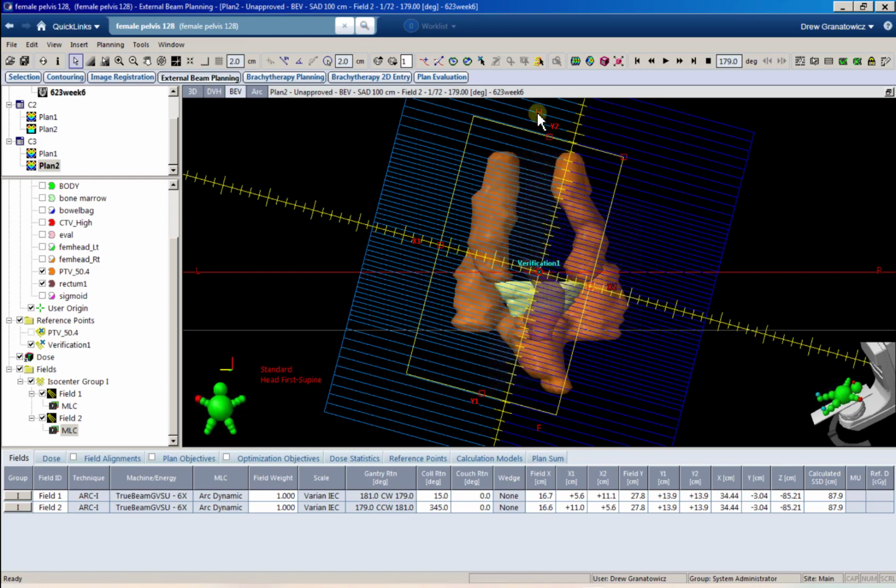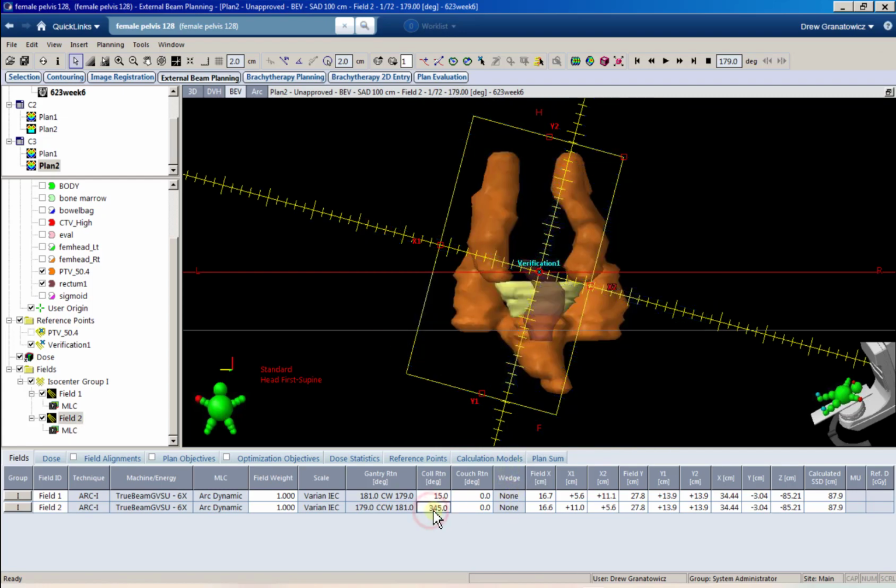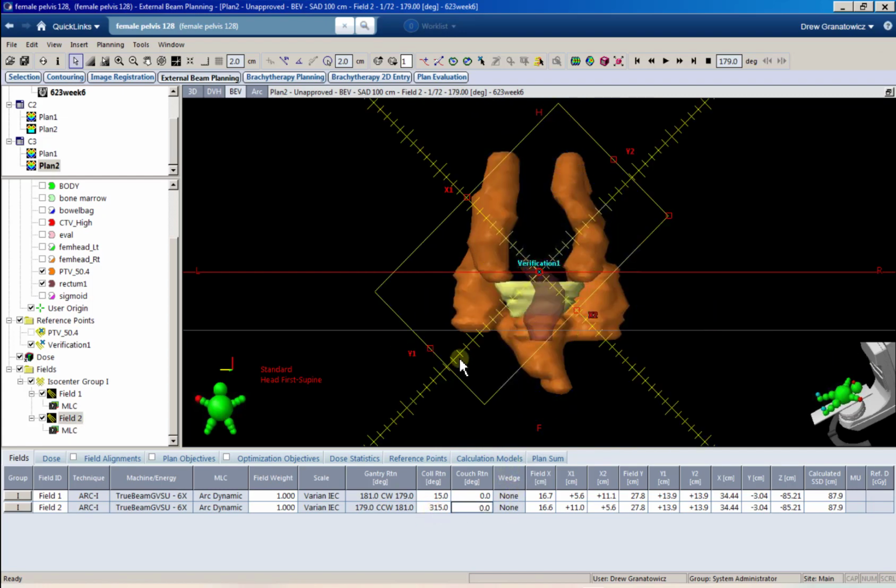So what I want to show you real quick, so imagine there's a straight line going straight up and down through your ISO. And let's say this was a little bit steeper, so I'm just going to make it 45 degrees in order to show you this. But right now, imagine a line straight through my ISO up and down. You never want to shrink your jaw past that imaginary line.